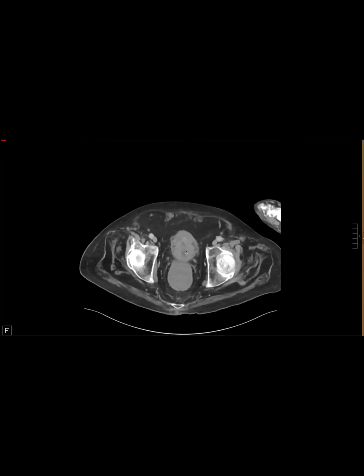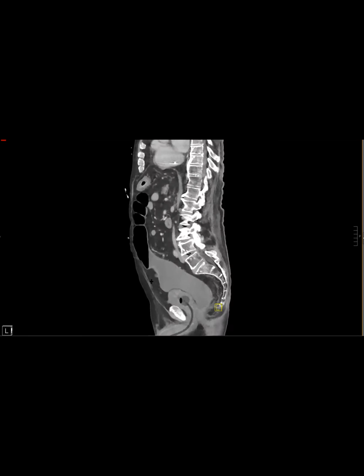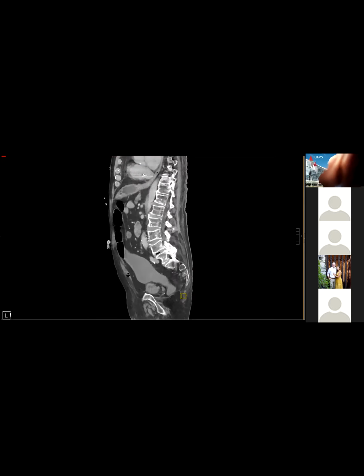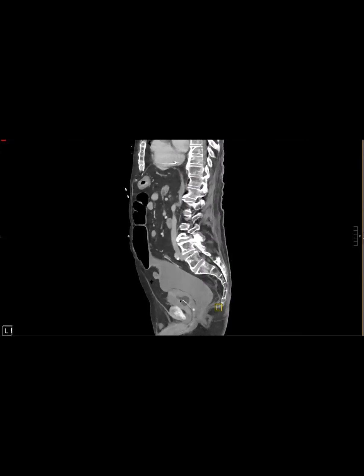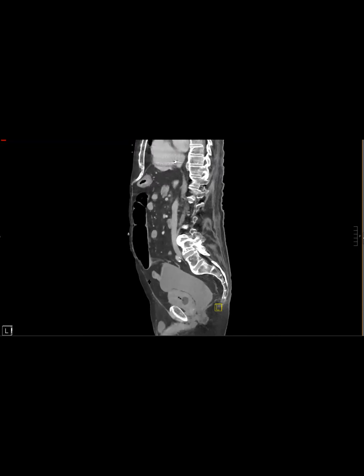Yeah, this is Steve. I think of this more as a urothelial phenomenon. Your case looks so mural. I don't know, maybe it's just because the bladder's collapsed and it's a fake out. If you had a distended bladder, it would be on the inside of the wall.